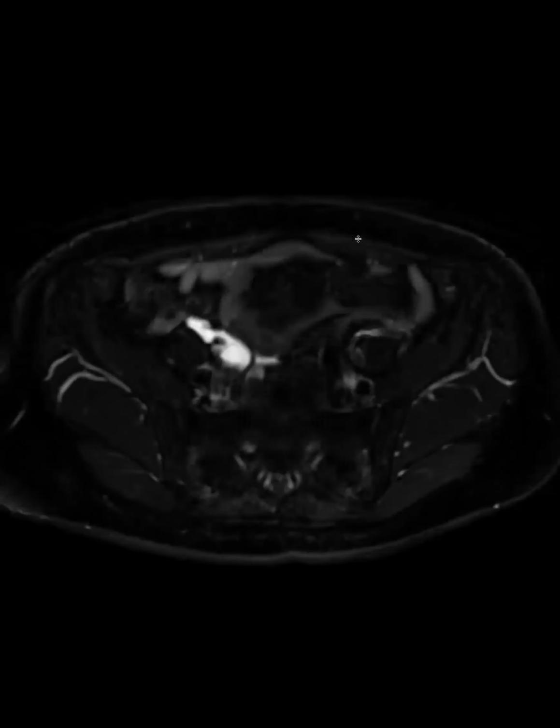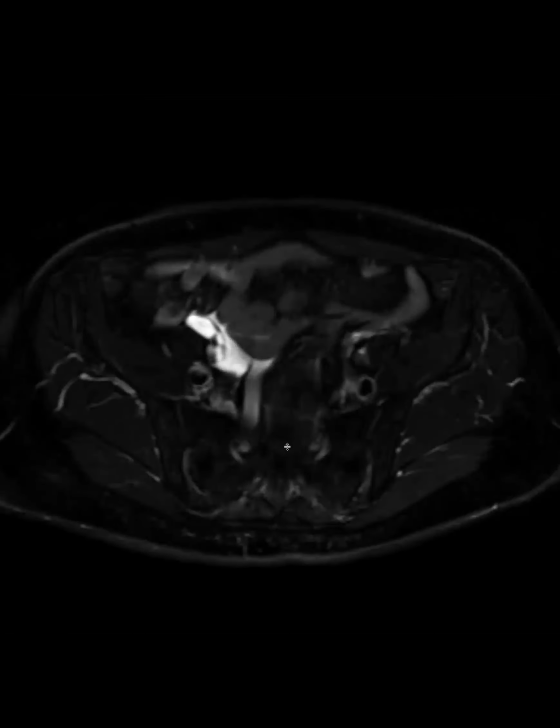Beautiful. It almost looks like an extension of the cisterna chyli, like when they do lymphangiograms and it crawls up the whole retroperitoneum. It almost looks like that, but dilated. See if I can get the more axial T2 large field of view. Okay, I have a fat sat version, but the cisterna chyli is a little higher. It should be behind the IVC, retrocrural, but below that, when they do lymphangiograms and trace it up, it goes through some lymphatics, so it almost looks like those engorged ones.